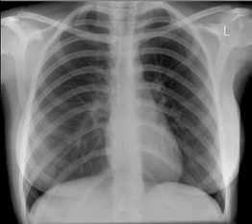The radiologist will then read the history. This patient presented with the history of abdominal pain 2 weeks after surgery for appendicitis, and the treating physician is suspecting a bowel perforation. Suspected pathology, if there was any, would be visible in this case as free air under the diaphragms, which of course is not there. So this X-ray does not have any sign of bowel perforation.